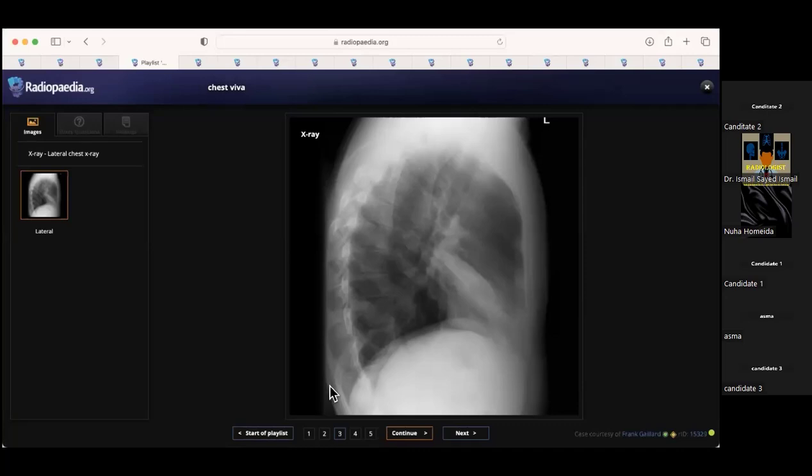I'm suspecting that there is an endobronchial lesion, like mucus plugging, especially if the patient is asthmatic, or maybe an endobronchial carcinoid tumor if it's a young patient, or endobronchial carcinoma, or other lesions. So I'd like to convey my findings to the referring physician and red flag this patient for a contrast enhanced CT scan as soon as possible, and if there is any endobronchial lesion, the interventional radiology team could do a transbronchial biopsy.